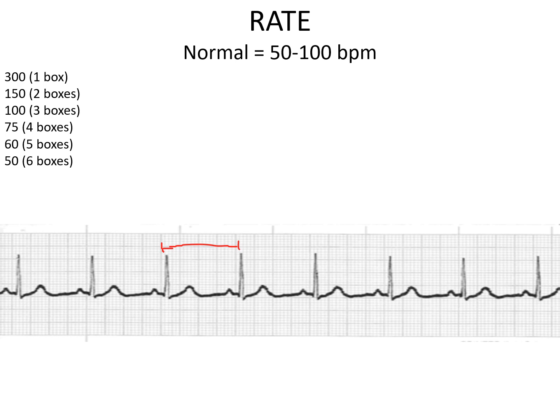If the rhythm is irregular, then there is a formula, which is 6 times the number of RR intervals in 10 seconds, because a standard ECG is 10 seconds. So when we count the number of RR intervals in a 10-second strip, we can multiply it by 6 and we can get the rate for irregular rhythm.